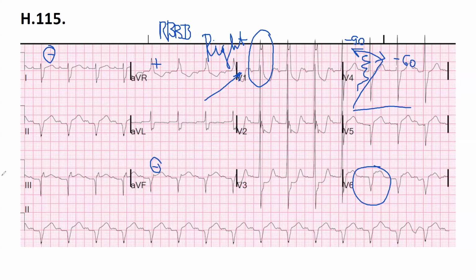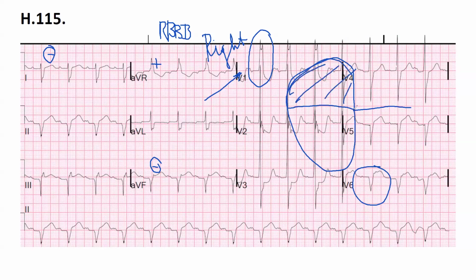This is not good. I completely did it the wrong way. Because lead number 1 is negative, we are here. Lead AVF is negative, so we are here. And AVR, of course, this one. So it's very rare, but we do have an extreme right deviation for sure.